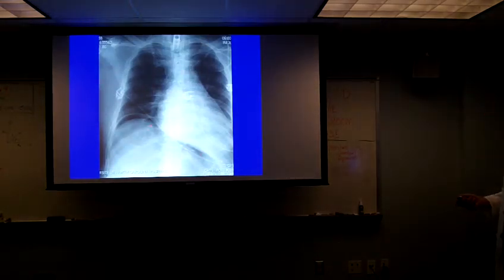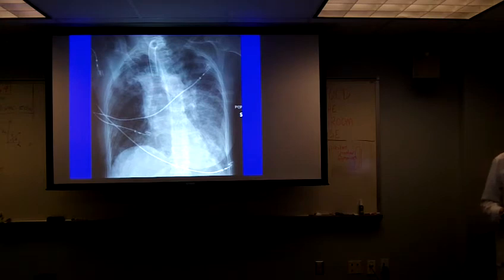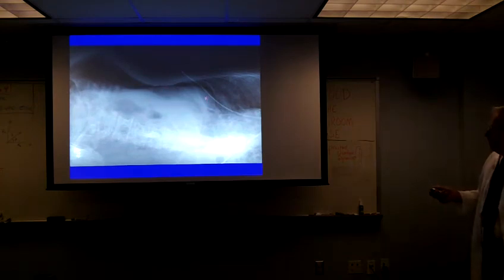When they set this patient up, it was obvious that there was an extensive amount of free intraperitoneal air. See, why did I put this one on? Oh. This is what you're looking for in the decubitus position.